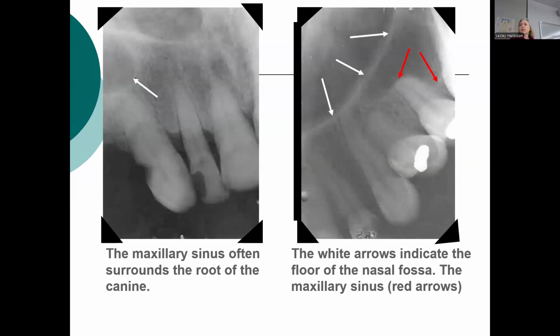And here is another one with a lot of foreshortening. Now we're getting into good examples of vertical angulation error. When you take these kinds of images in class, you can see the vast difference between taking a premolar that looks like this and taking a premolar shot where your film was parallel to the tooth and your beam was perpendicular. It comes out much more true to size and true to shape, as opposed to when you have some distortion, and then it looks very different on the X-ray.